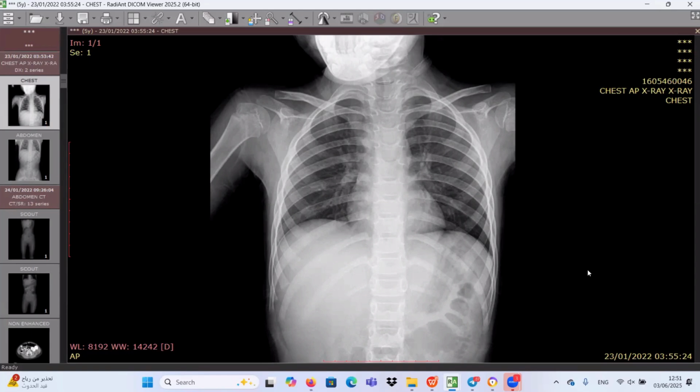Okay, sir. I'm provided with a chest radiograph. First, I'm looking at the heart and the mediastinum, and they appear normal. The bilateral lung markings are also normal. I could not appreciate any opacity, consolidation, pneumothorax, or effusion within the lungs. Now I'm looking at the bones. The chest is clear. I could appreciate that there may be some catheter placed from the left side.